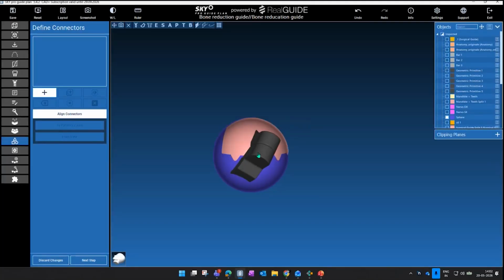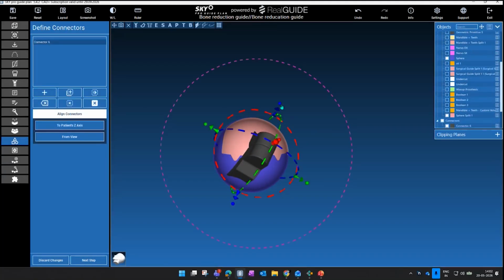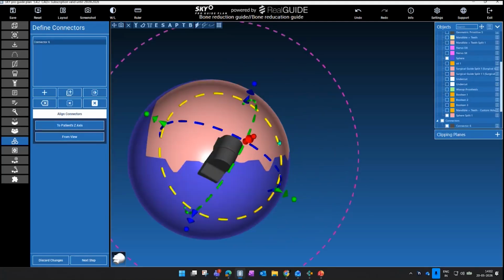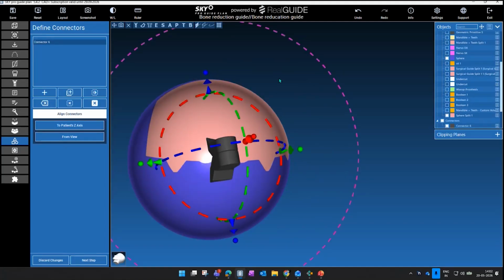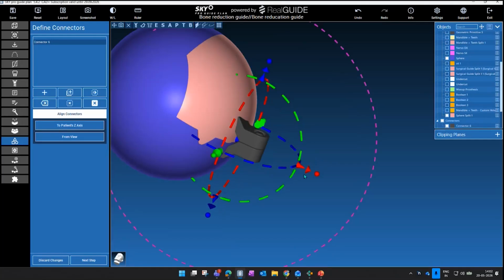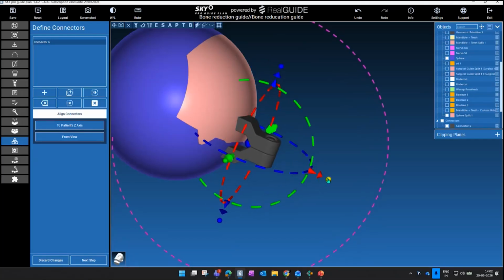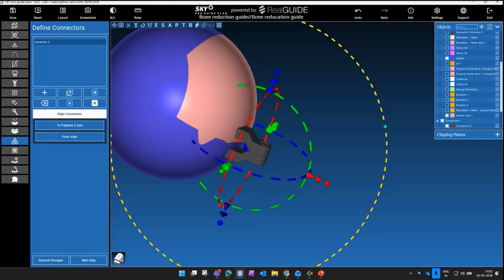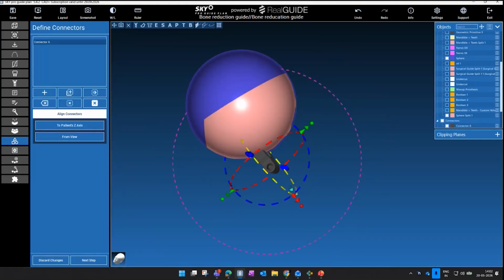And then I click and reduce the size of it, position it well, reduce the size of it still more. So position one part in the blue and one in the orange or pink, whatever it is.